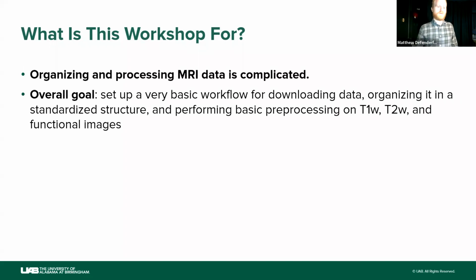So the overall goal is to set up a very basic workflow for downloading data, organizing it in a standardized structure, and then performing very basic pre-processing on T1 weighted, T2 weighted, and functional images. And we've got a few tools for that. So the tools that we've got are Xnat.